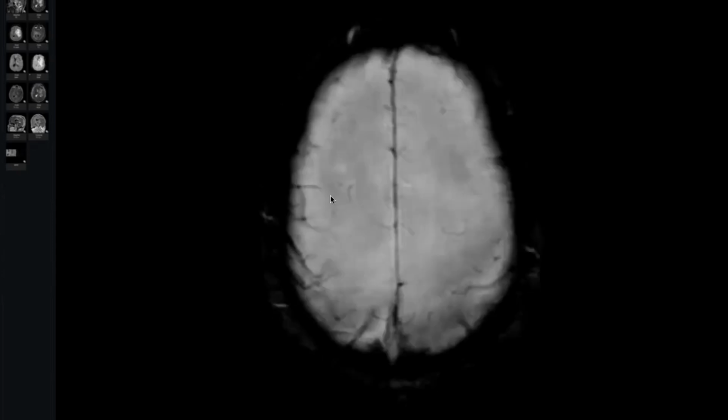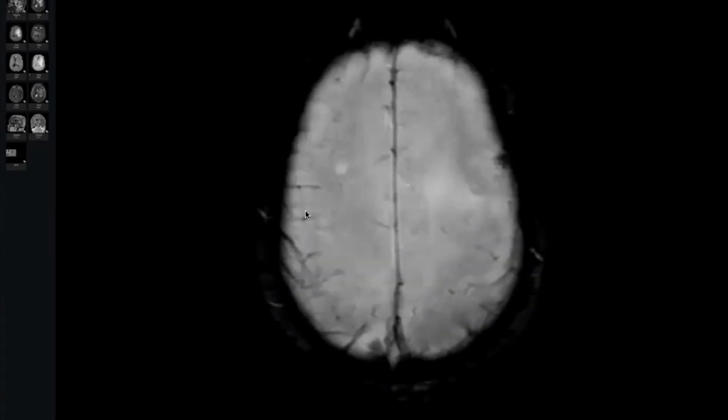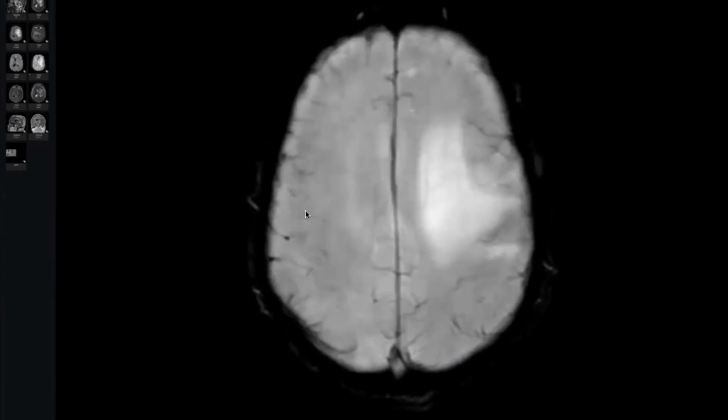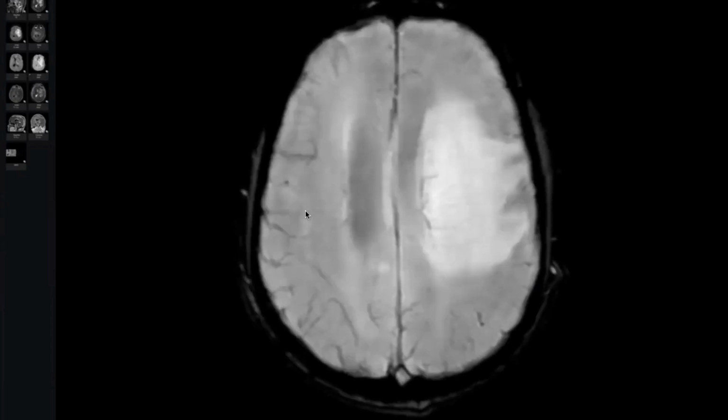My colleague, by the way, the susceptibility weighted images were originally used for venography. Why? Because they found, see, these are the veins, that you can make a venography by SWI because the blood contains iron, and the iron can cause susceptibility artifact. Later on they used it to detect bleeding.